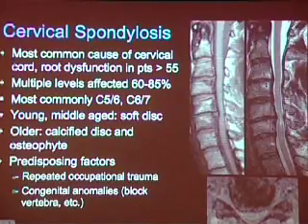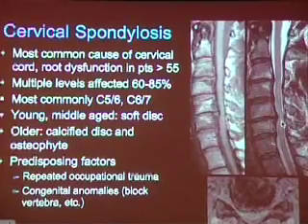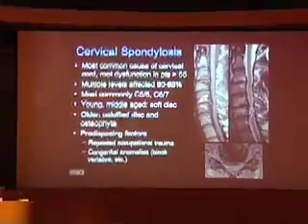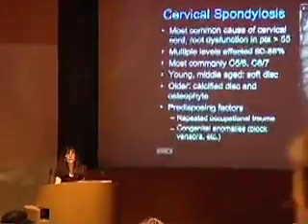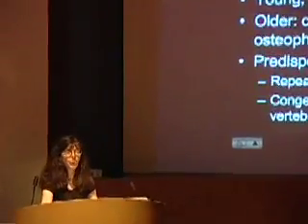On the T2 weighted images, we see that as well. And not only that, but we also see a focus of high signal intensity within the spinal cord. Now, when you have a cord that's pinched like that and the cord can't be allowed to expand, you don't necessarily know if that focus of T2 abnormality is edema or myelomalacia. But the chronicity of the patient's symptoms, whether there was any recent trauma, you may have to resort to other methods of figuring that out.